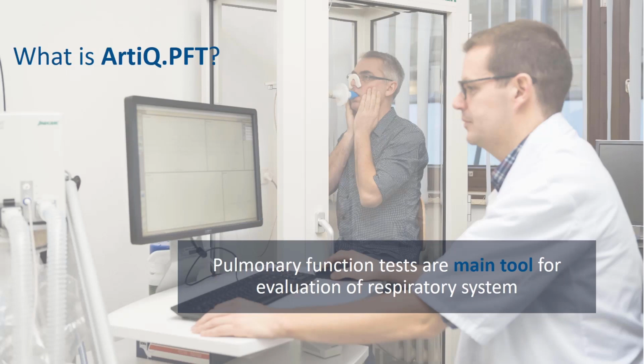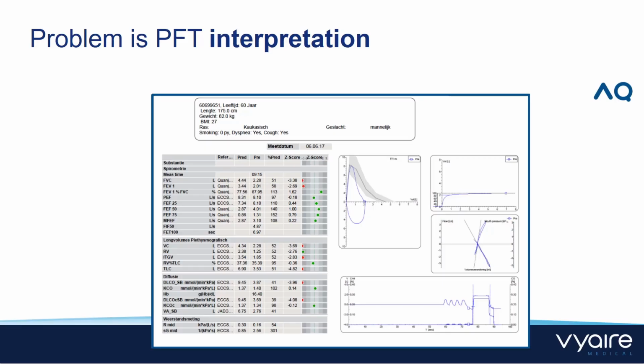Pulmonary function tests are the main tools that doctors have to evaluate the respiratory system and thus to diagnose and follow up lung diseases. The main problem with pulmonary function tests today is the interpretation. A typical PFT report contains a large number of parameters that are measured and calculated.